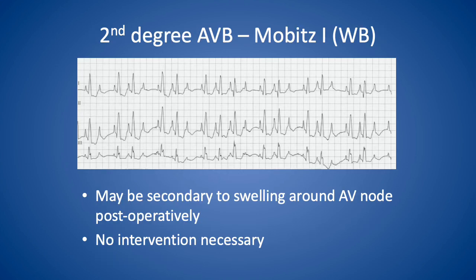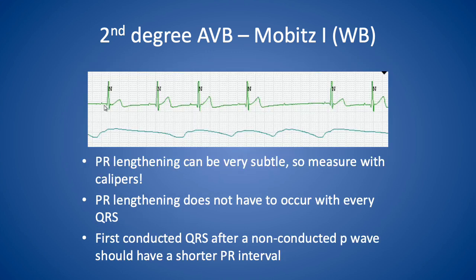Second degree AV block or Wenckebach block can also be associated with our post-op neonates who undergo cardiac surgery. Typically, it's related to the swelling around the AV node. Again, here no intervention would be necessary.